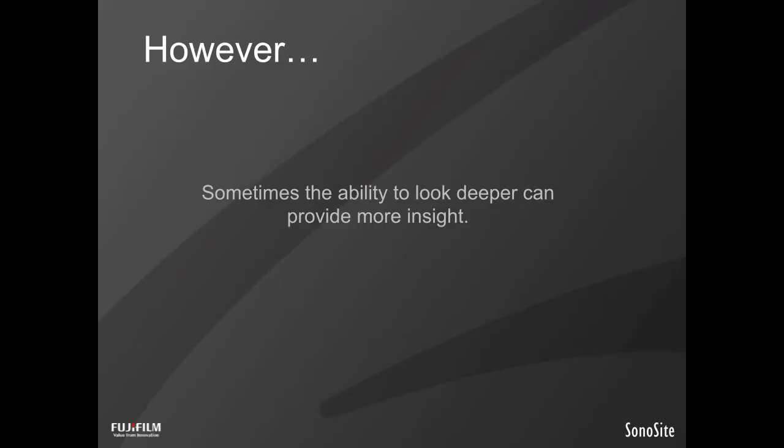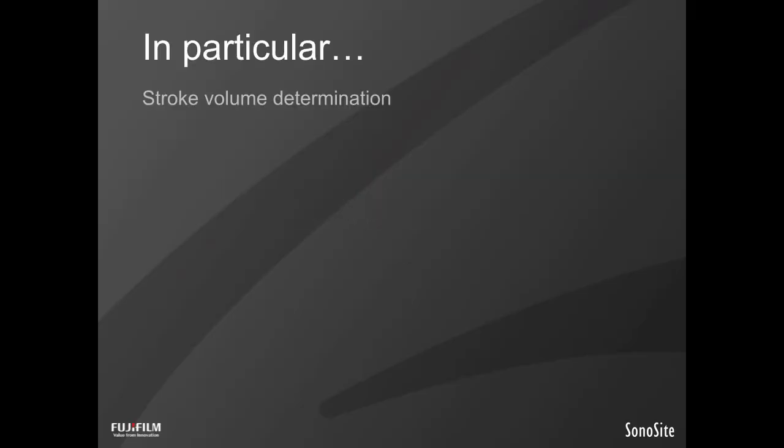Sometimes the ability to go a little bit deeper and get a little bit more slick and quantitative with the left ventricle in particular can provide more insight. And I'd like to discuss that with particular view, not of doing ejection fractions, because ejection fractions are kind of a made-up construct. It's not physiologically relevant. What is physiologically relevant is stroke volume. And stroke volume determination can be done relatively easily at the bedside.